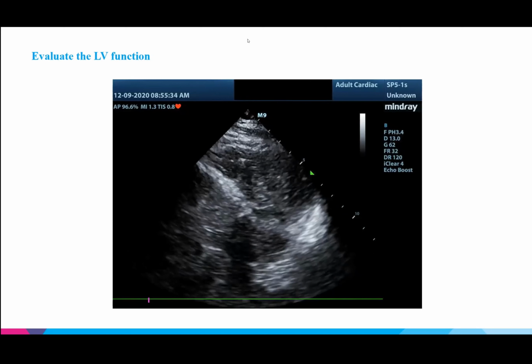And then in the chat, what do you guys think of this view? Okay, good. Does everyone agree with the view?